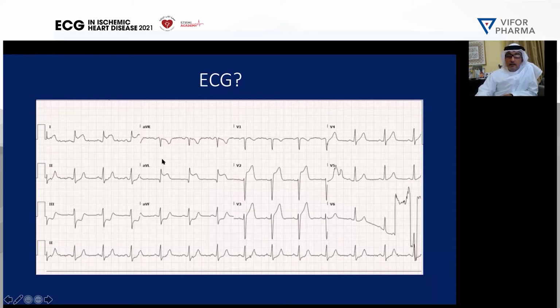So anterior, and then here, in this case, I'm going to show you the localization. You have to be familiar, first thing, with the diagnosis. The second thing is the regions or the localization of the MI, because some regions have certain complications and certain outcomes. Usually anterior MI is very bad in terms of prognosis compared to inferior MI. Isolated lateral or isolated posterior is lower risk compared to massive anterior, or anterior with posterior, inferior posterior. Those are high risk also.